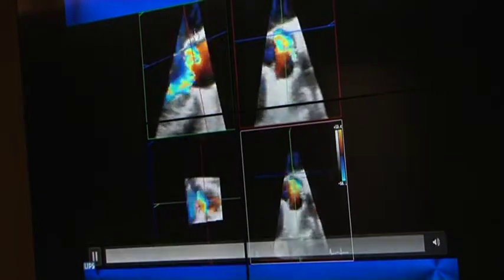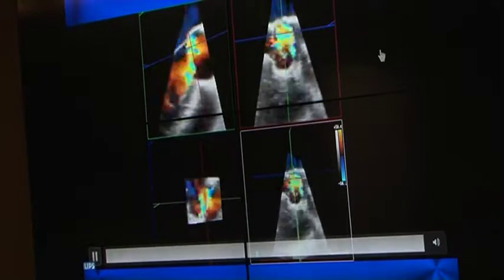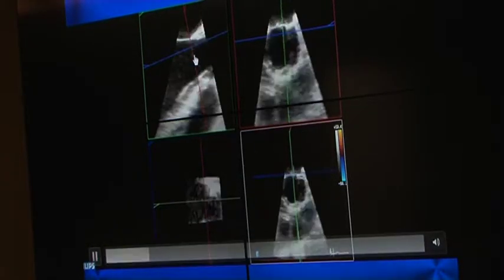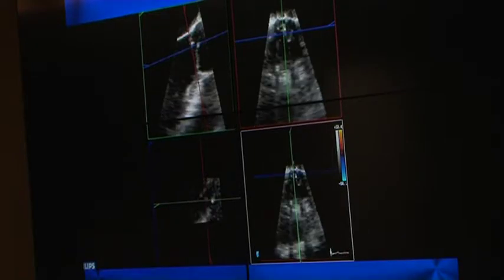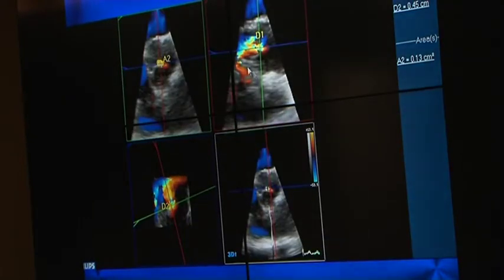You can see that this jet originates from a posterior superior position going anteriorly, and with multiplanar reconstruction it was nicely visible that this jet is a consequence of a severe prolapse of the non-coronary cusp. So in that case, the pathomechanism was, according to the El-Khoury classification, El-Khoury 2A. So it's a very detailed analysis and needs some experience, but it is not too difficult to learn.